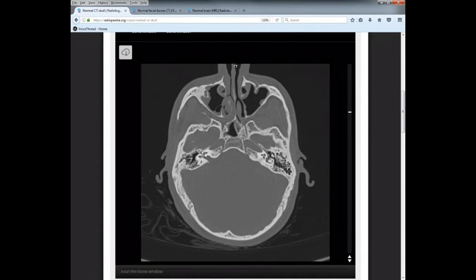And then if you look just posterior to that, there's your internal auditory canal. And it should make sense because this is where the nerves are going to head up into the brain and allow you to actually interpret the hearing, the noises that these bones in the inner ear are interpreting. So those are the foramen that you have to know.